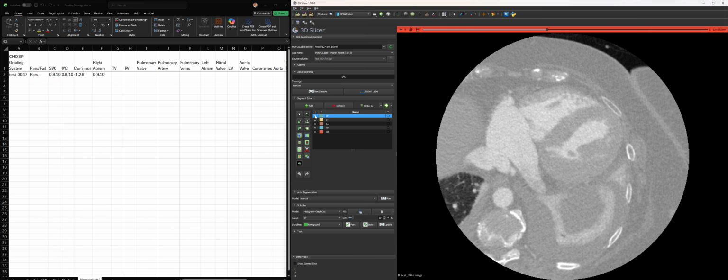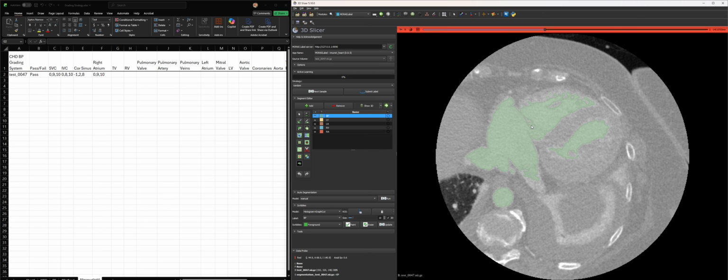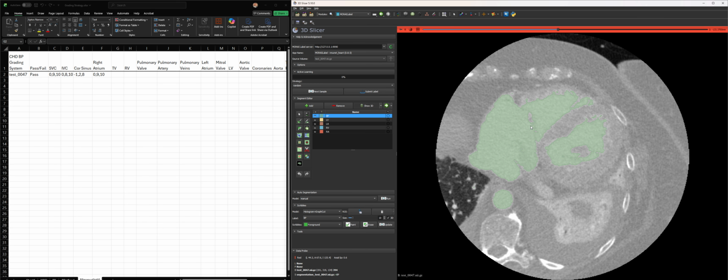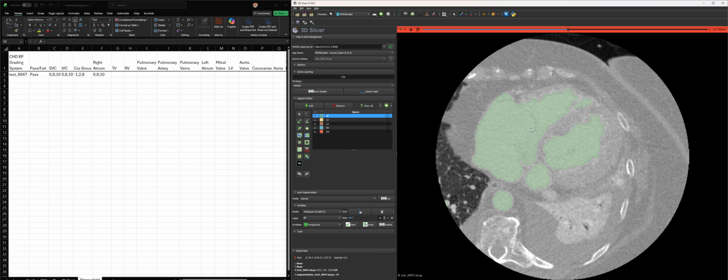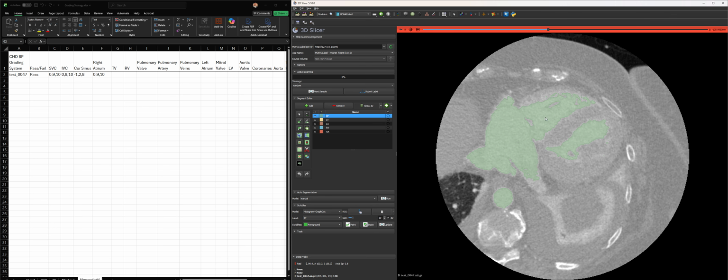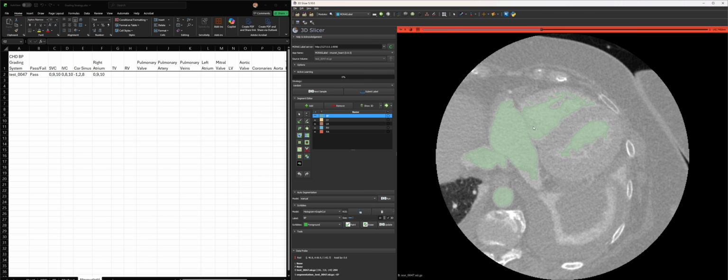And so now let's look and see how much of it was captured. It's probably, and there's a little bit there. I mean, number one, it's going to pass in my book because the tricuspid valve doesn't need much to pass. It passes because in the model, if I had the binary mask, I'd say, oh, I can figure out where that is, even though it's probably just half.